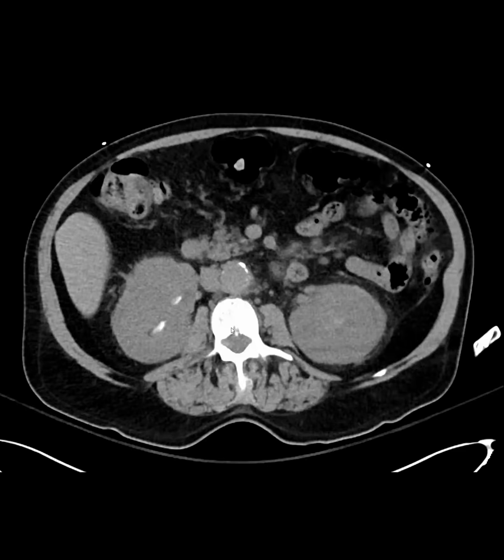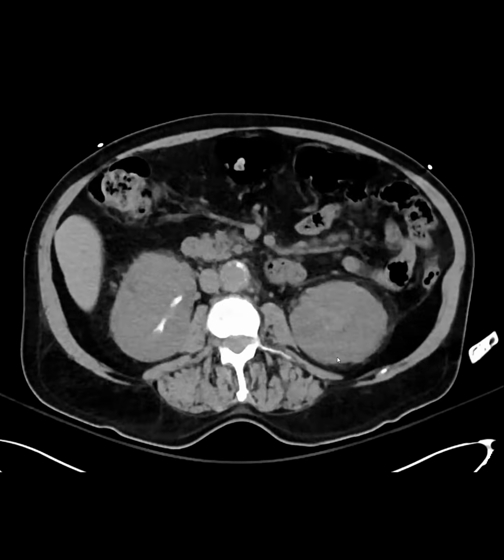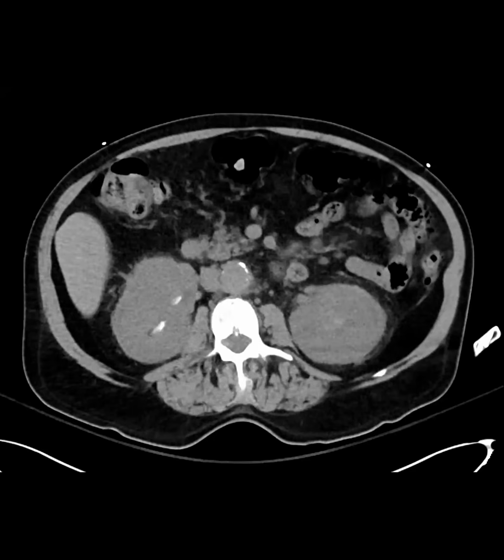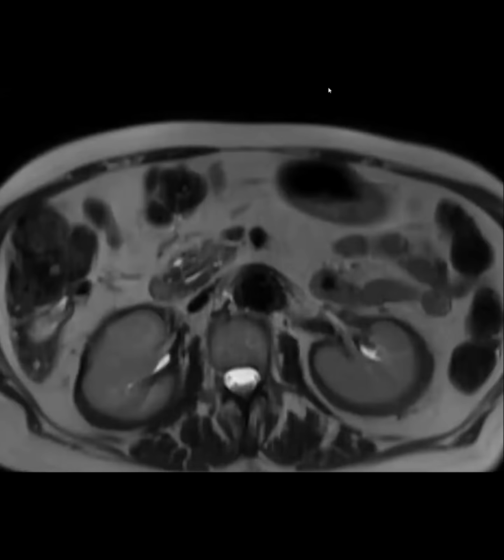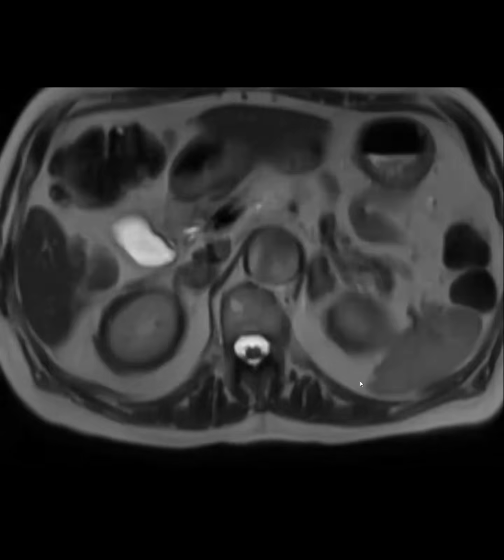There's some kind of vascular process, systemic vascular process. Okay, my thought. Also a possibility. Okay. Now I'm going to show you an MR a few months later. And it looked like this. Oh, whoa.